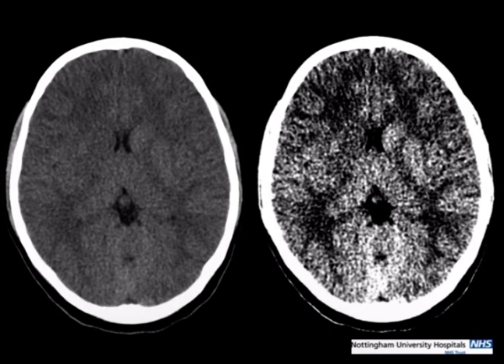But they tend not to be quite as obvious in their clinical presentation as adults. This is a 12-year-old who had sort of a day or two of headache. She kind of wasn't quite right, had some left-sided facial weakness. So it wasn't immediately obvious what was going on, but CT head, again, just to reiterate, I'm sure you'll do this anyway, but to use stroke windows.